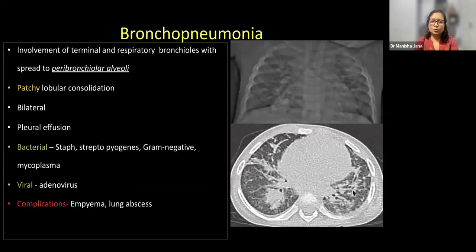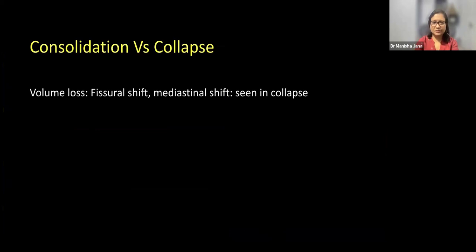To the contrary, the bronchopneumonia pattern is usually around the bronchi, the peribronchovascular bundle, multiple and bilateral. This bronchopneumonia pattern is more common in viral pneumonia. However, some bacterial pneumonia can also show this kind of appearance. Atypical pneumonia like mycoplasma can also give rise to this appearance.